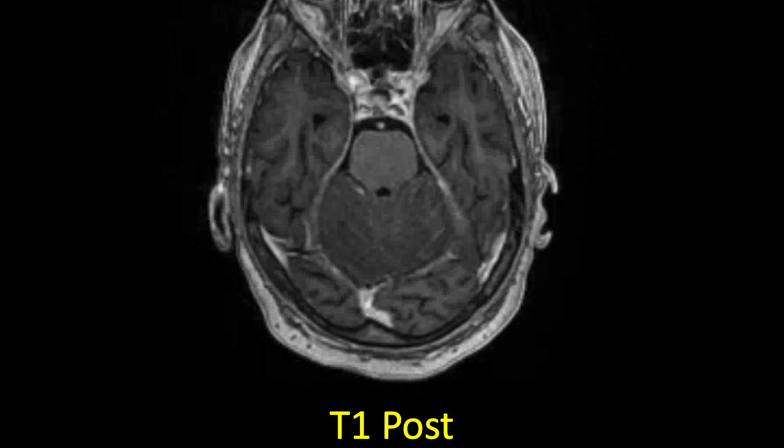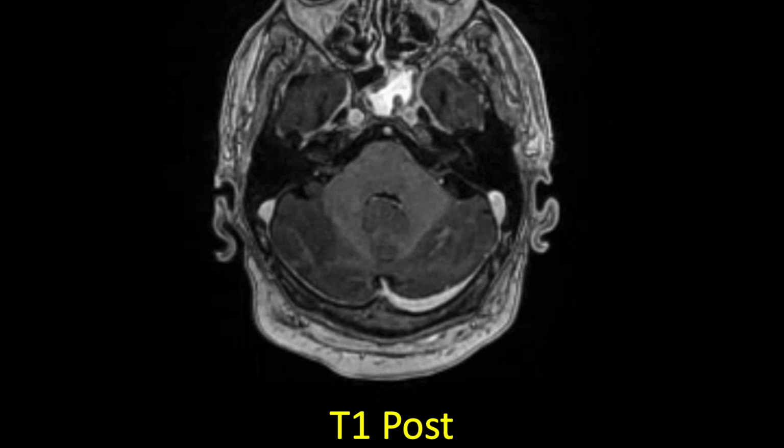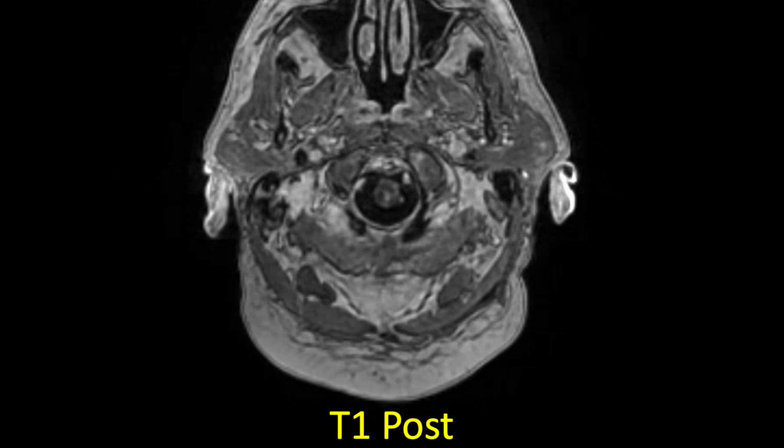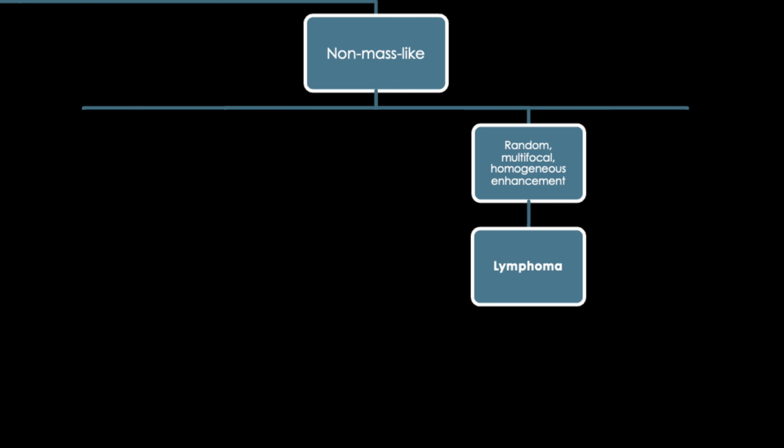If there are random multifocal lesions that display that characteristic homogeneous enhancement, consider lymphoma, which can present both mass-like and non-mass-like. Lymphoma is one of the great mimickers. You can almost never go wrong suggesting it with any weird enhancing and restricted diffusing process.